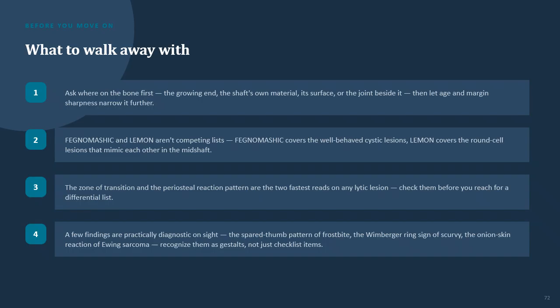The other condition or pattern that we looked at was Ewing sarcoma, and again, it produces that onion skin-like periosteal reaction. These are just a few of the conditions that we looked at. There were many, of course. When we're looking at these on imaging, we should know right away that they are abnormal because we should know what normal looks like. But just because it looks abnormal doesn't mean it's necessarily harmful to the patient. It doesn't mean that it is malignant, because it could be benign, or it could be normal for a patient of that age.